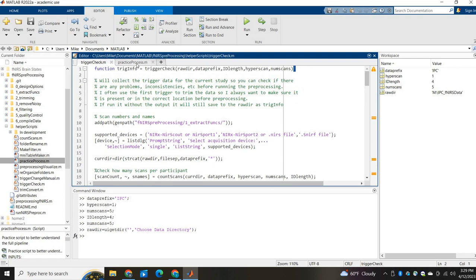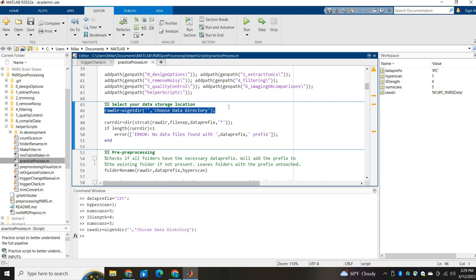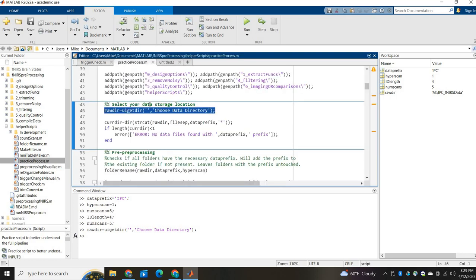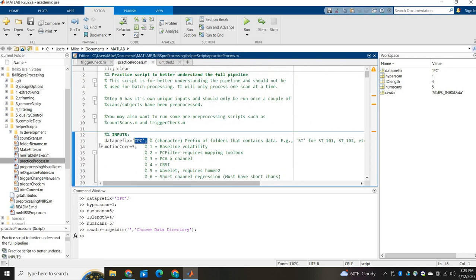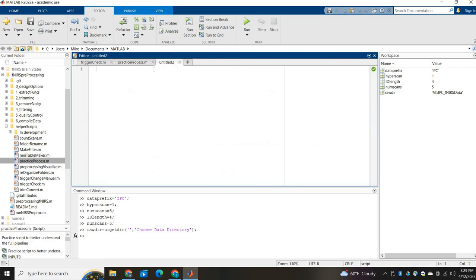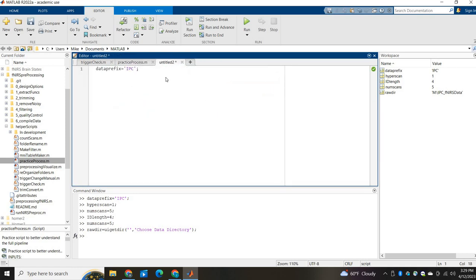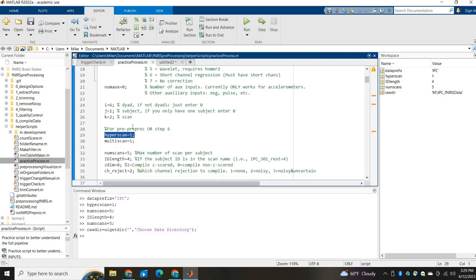So a different way to do this, if you want to do this a bunch of times for some reason, would be to steal some of these variables. I like to just put it in a script. This is a very lazy way of doing this. You could even make a script to run this a bunch of times.